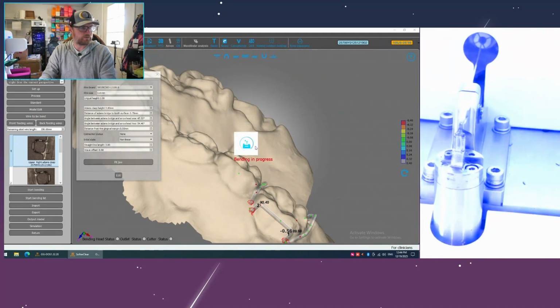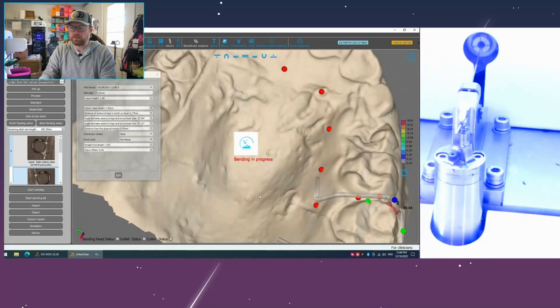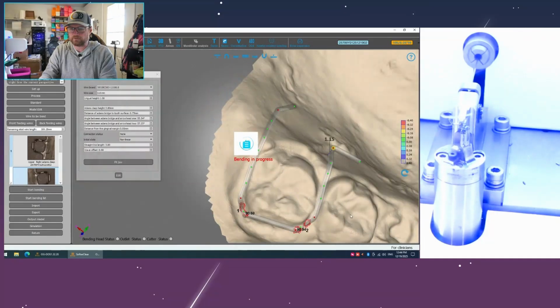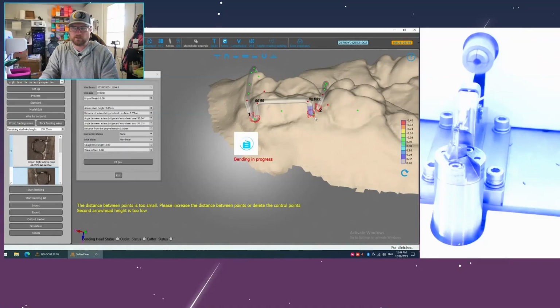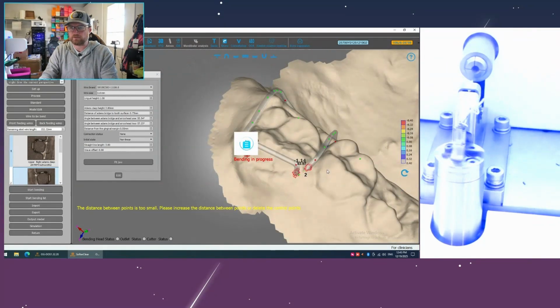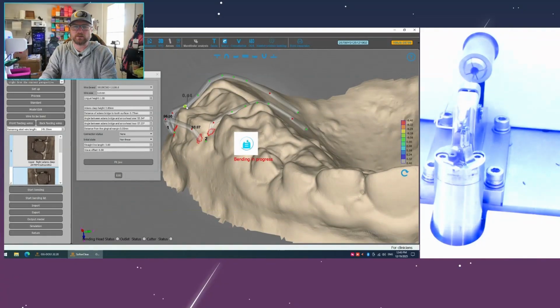We're going to start bending and continue. And then we're back to the wire bender starting, and then we're going to go to the other Adams clasp. So you can see how it'll get pretty quick when you're used to it. So they made this one straight too, and I like these to be just a tad longer. What I can do is save this if I want to. Yeah, I think I need to pull this down. I'll relieve those gums later. That one probably doesn't need to be pulled down. Hit the letter T to straighten that. I'm going to pull this down a bit.